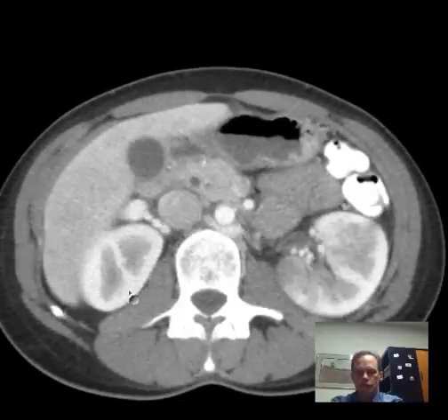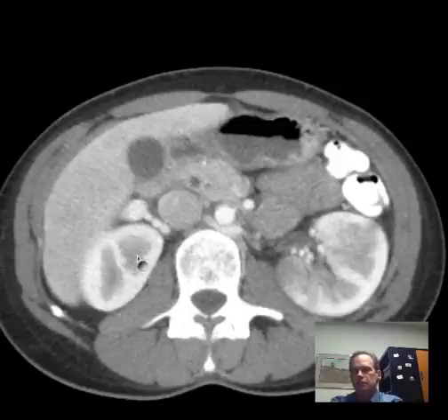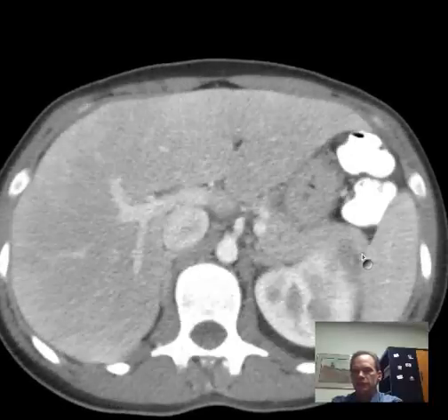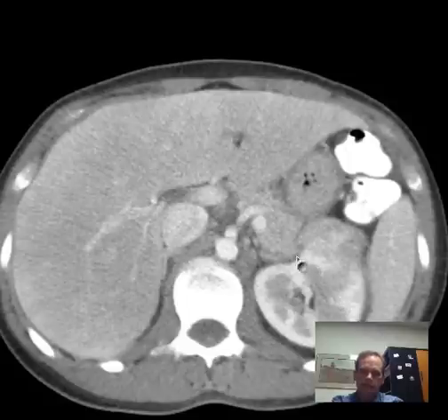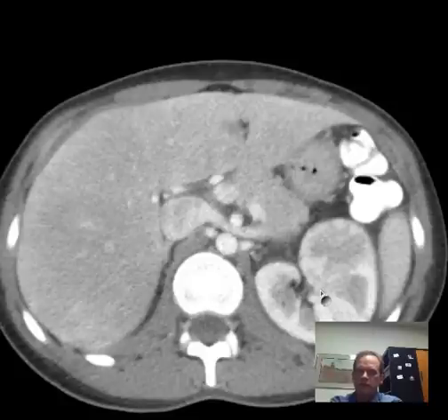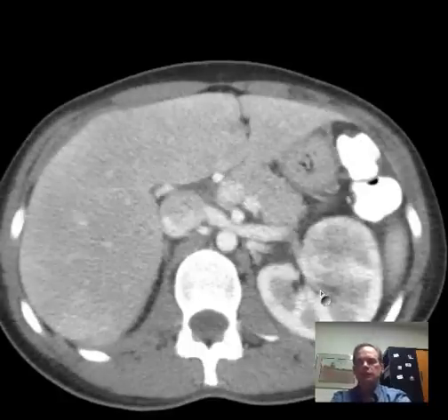So here you see nice renal cortex enhancing with little enhancement as yet in the renal medulla, and here you see the same thing, not quite as high up, but if we go up high there you see the same kind of thing. This sometimes looks like a sliced tomato, is kind of the architecture of a kidney in the axial plane. So everything looks hunky-dory around here, but this looks fuzzy.